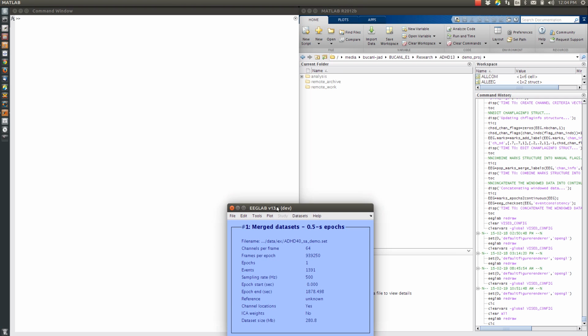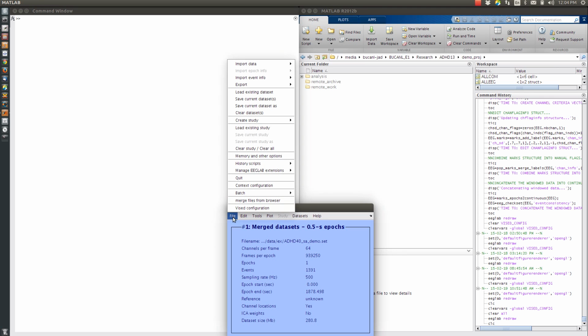So to get started, here's EEGLAB, and there are basically two extensions. The main one is the batch context extension, which allows you to execute scripts generated from the EEG history field, or just to execute binaries that are developed, such as the Amica binary. So as an overview, I'll just go to the batch menu and run a history template batch.